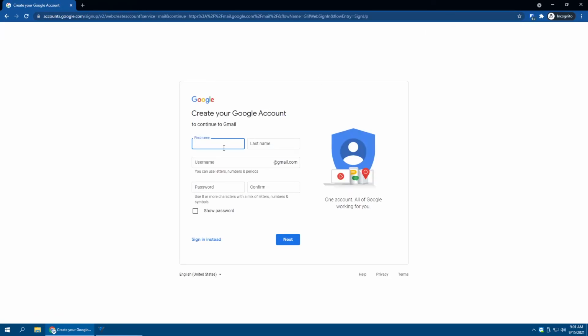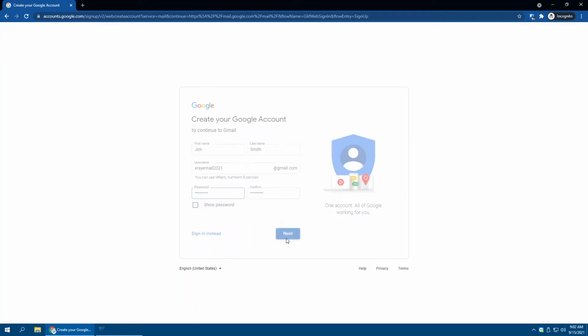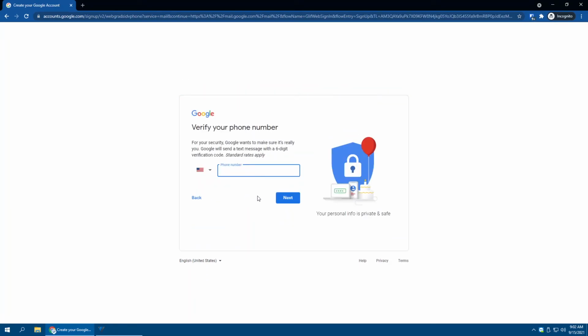And here I'm going to put in a name, we'll see if that's taken. Pretty sure it will be. Okay, guess it's not taken.